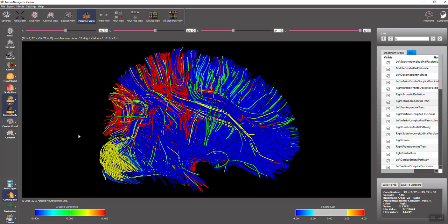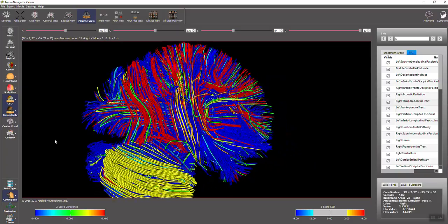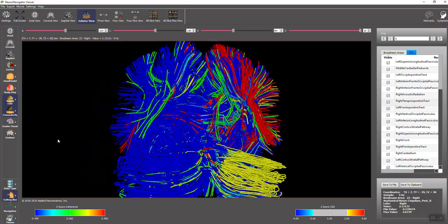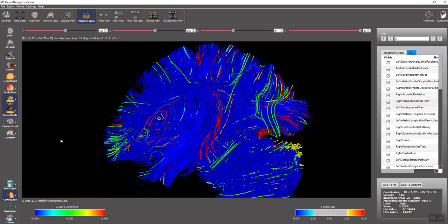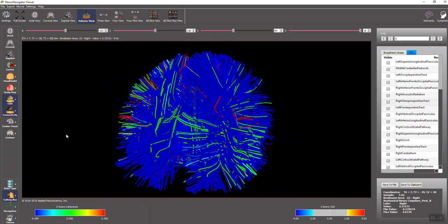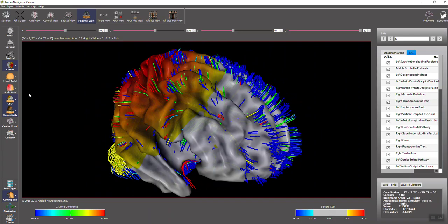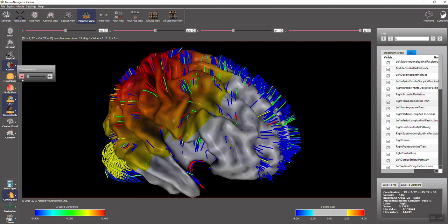And now this will be available in the NeuroGuide demo, so people can play around with this and learn more about various aspects of the brain. And then, of course, add the current source densities from the cortex itself. For example, I can add the cortex here. I can make that cortex a little more transparent.